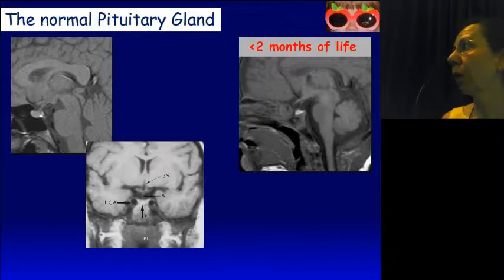And this is a coronal scan. Up to now, very easy, T1-weighted images. You see the chiasm, the third ventricle, the pituitary stalk. It should be in the midline, and of course, the pituitary gland and the cavernous sinuses with the carotid.